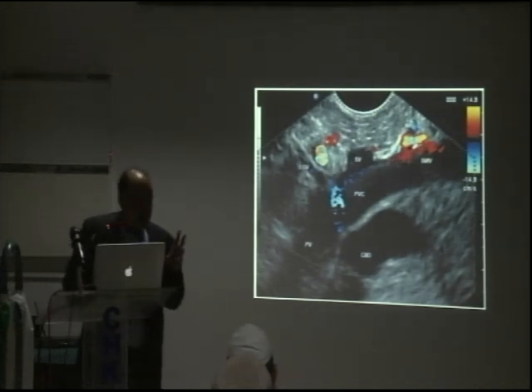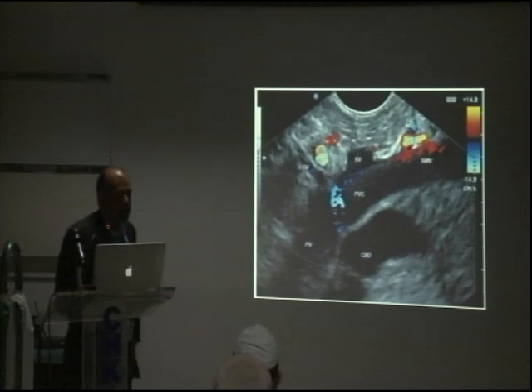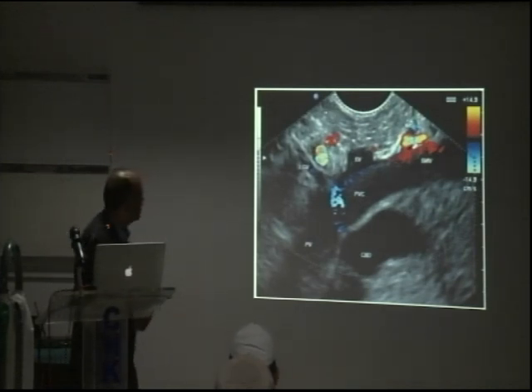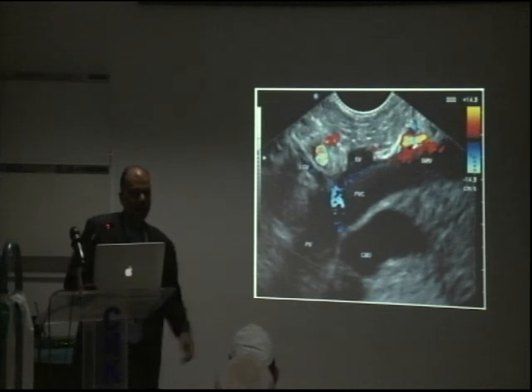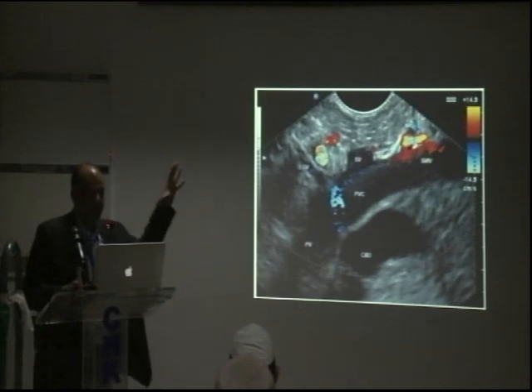As I said, the templates which you create in your mind would cause you problems here. So what's the problem here? It's the same picture, but it has been flipped. Look at the head side, it is on this side. Normally what the Americans teach is you have the head side on this side. The Europeans teach with the head on the other side. It's the same picture, but the head is on the other side. So see what happens if you created a template.